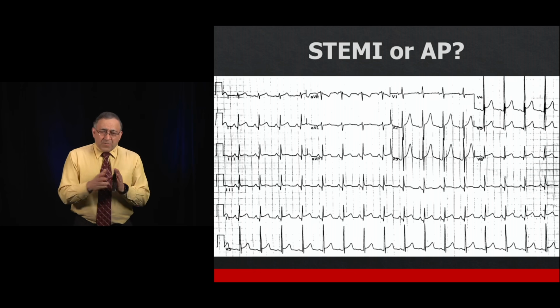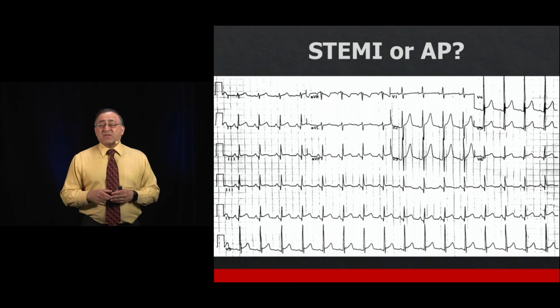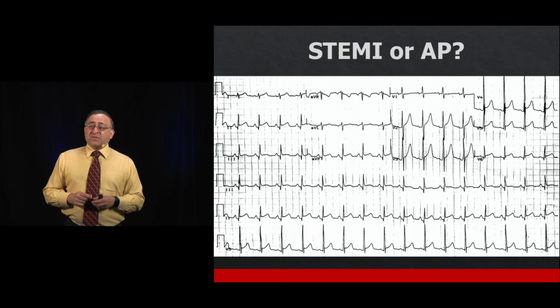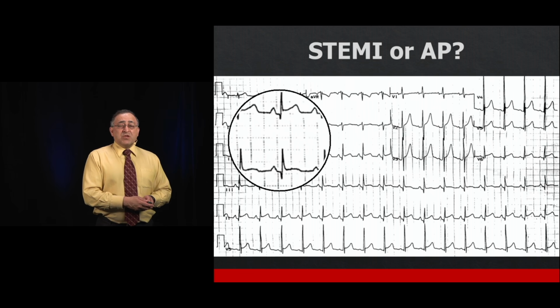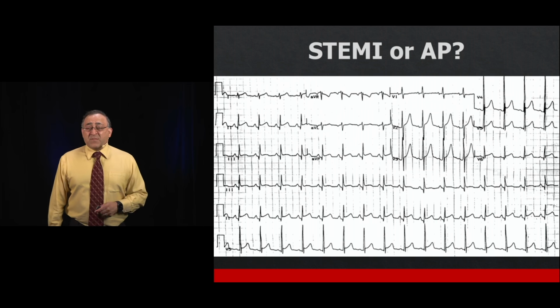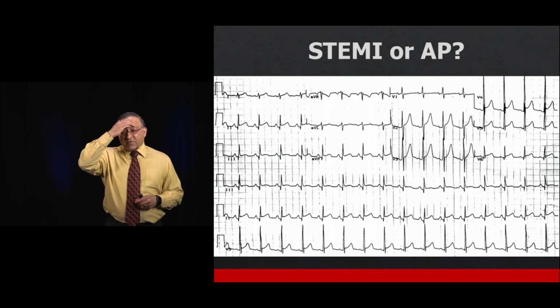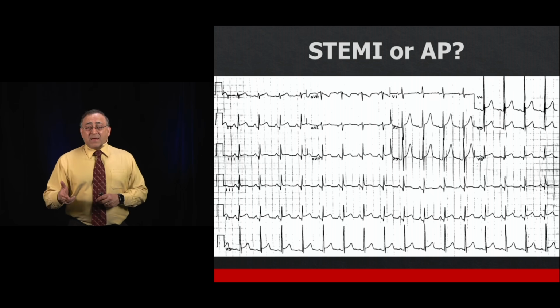Now, I'll tell you what actually happened with this patient. The emergency physician taking care of this patient actually diagnosed this patient as having a STEMI, and so did the computer. The reason for the misdiagnosis was the emergency physician was focusing on the Q waves in the inferior leads and thought this is an inferior STEMI, maybe infralateral STEMI, but at the very least an inferior STEMI. And the patient ended up getting aspirin and heparin and TPA.